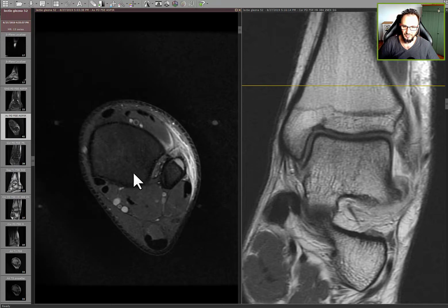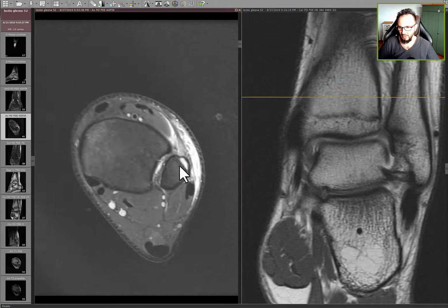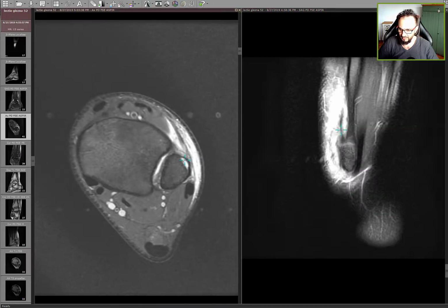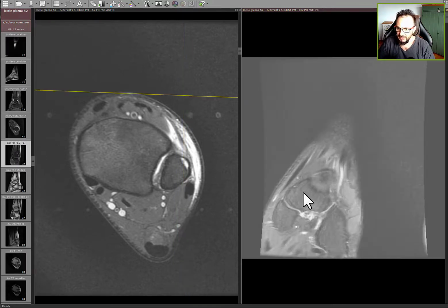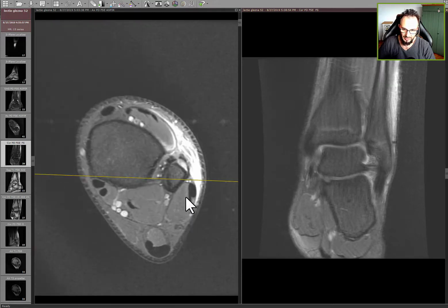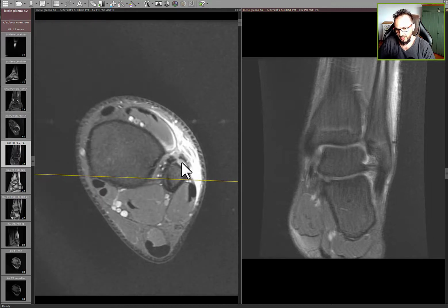The main issue here, which is this area here, it's fluid signal, it's on the distal fibula, and if you come down to see it better, you will see that it goes above the metaphysis. You see it here, it's from here to here, around 4 centimeters. You can better see it on coronal images. So what is this? This is probably stripped periosteum with haematoma underneath.